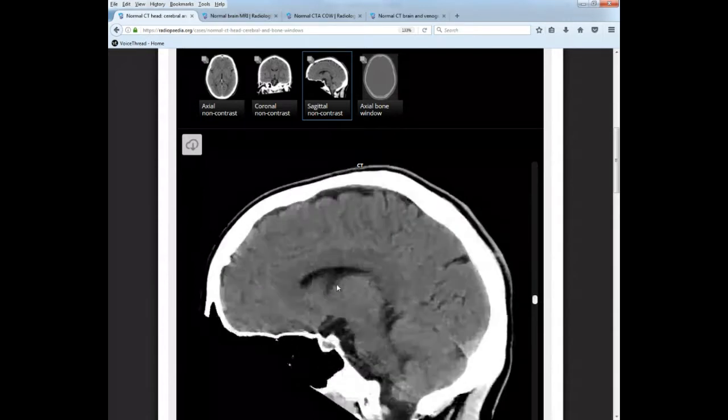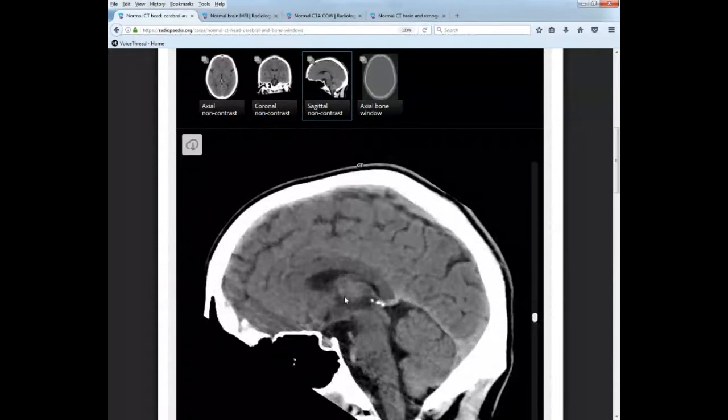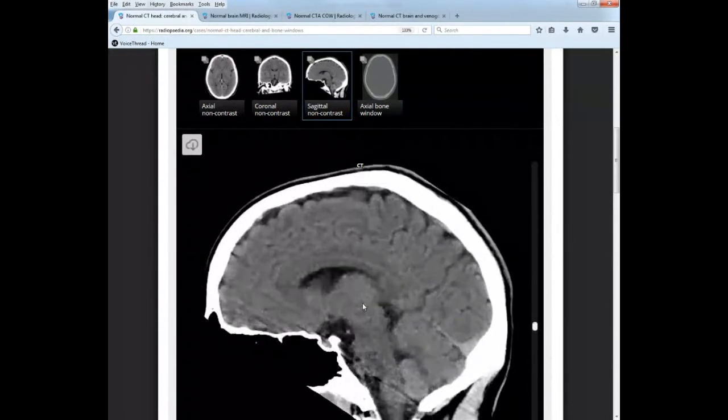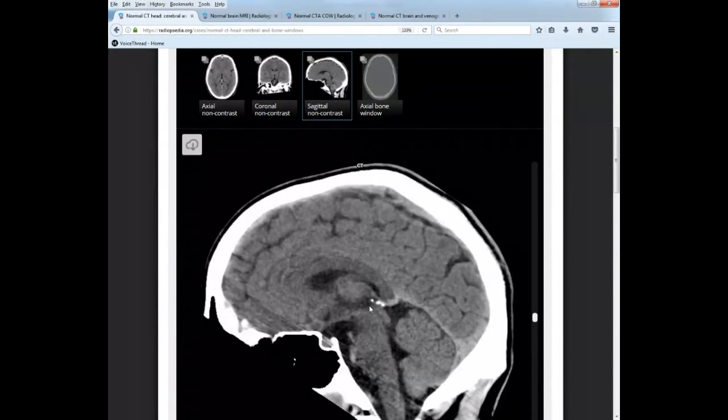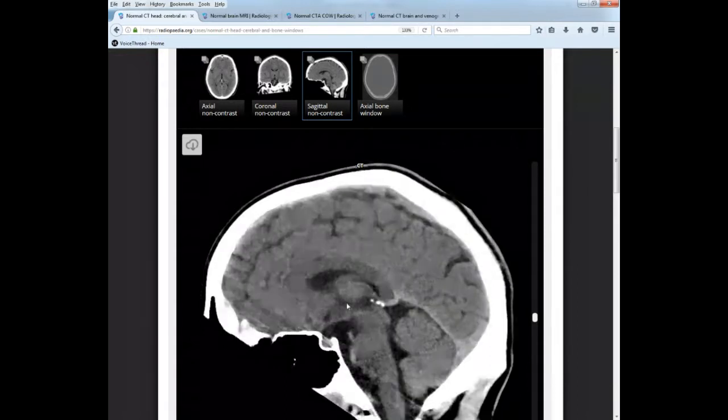Your lateral ventricles. Your 3rd ventricle, which remember I said on one slice it would be gone. This is your 3rd ventricle in here with the thalamus making up the walls of it. So can't quite see it. It's not really easy to see. But what you can kind of see here is the foramen of Monroe, or the interventricular foramen, emptying down into the 3rd ventricle, okay?